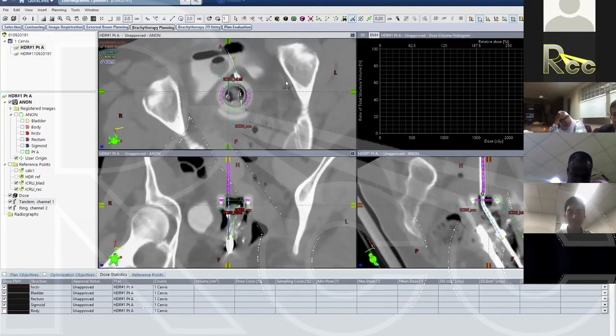Look at all of those, and then go back to your dwell control window and make sure that everything makes sense and that you're not very far from your point A original plan when you're starting to optimize to volumes. And that's especially important if you're using any types of graphical optimization.